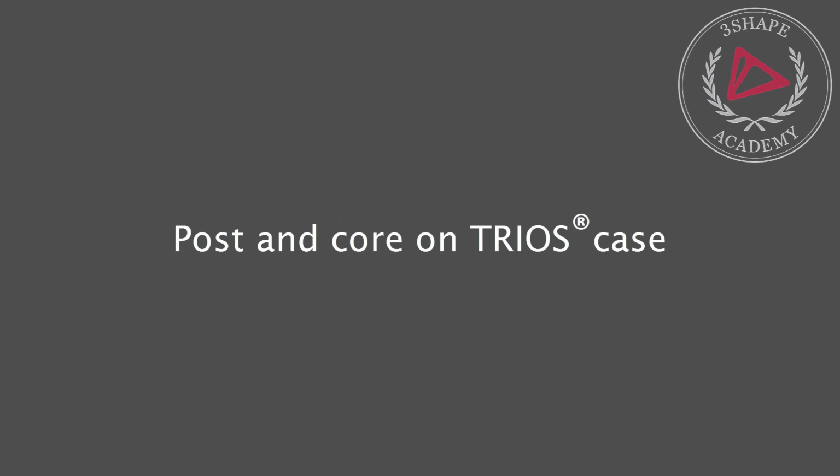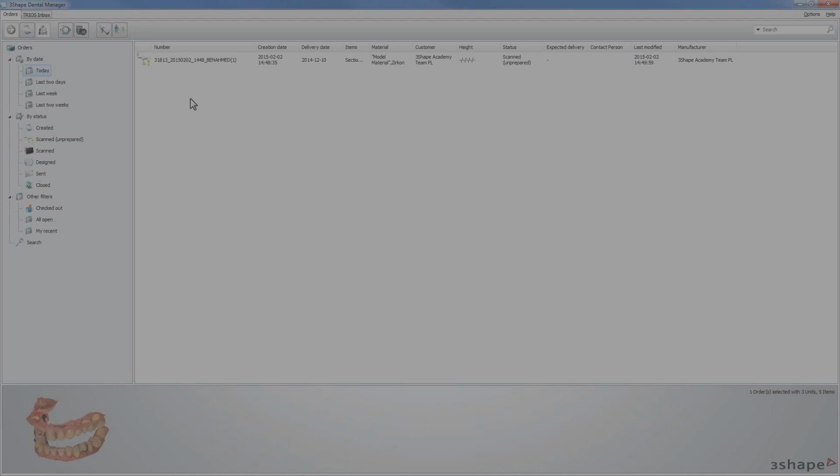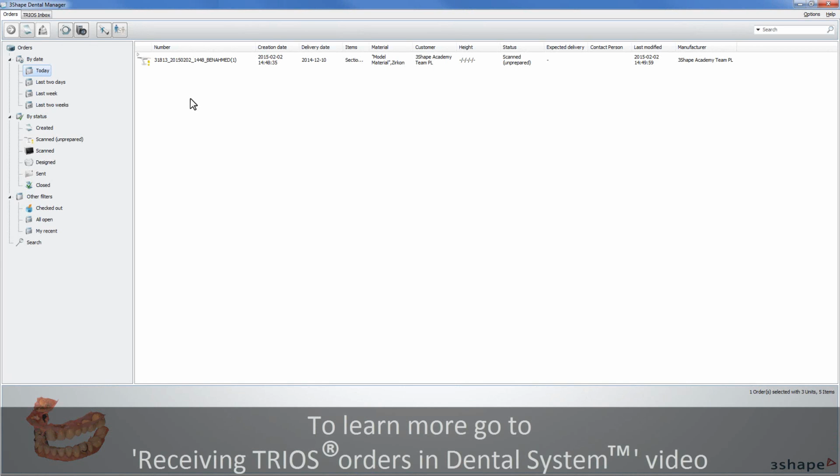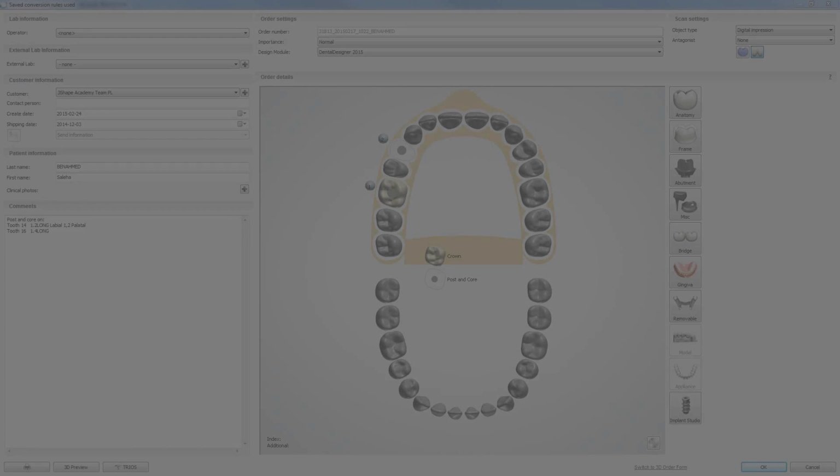Welcome to our video about post and core on a TRIOS case. For the videos, we have already imported an order into the dental system. To learn about receiving TRIOS orders, please watch the video Receiving TRIOS Orders in Dental System.